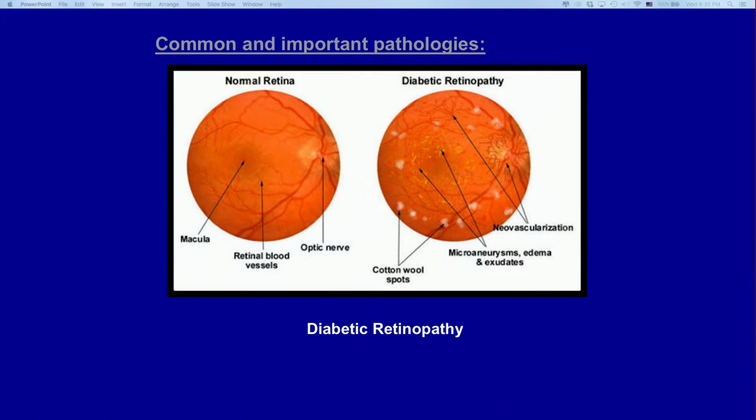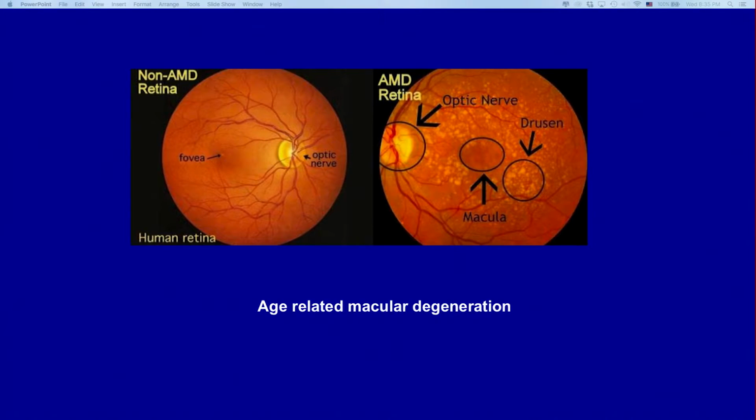Here are more examples of the bad things that can go on with diabetic eyes. And this is labeled now. So this kind of labeling is sort of what I'd like to get. I'd like to start with the raw image, and then have some automated system that gives me all of this. These are just technical names for these things. And that's an example of macular degeneration.